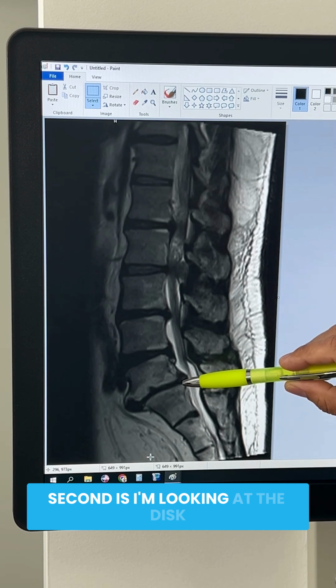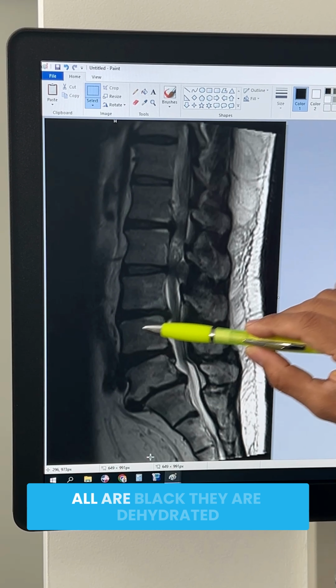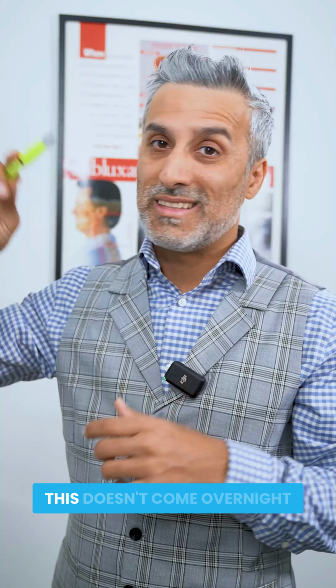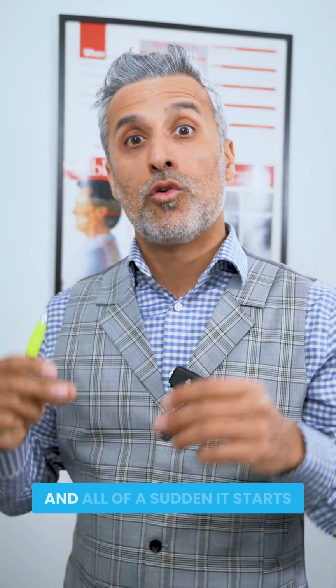Second, I'm looking at the disc spaces. They're very compressed. If you can see that they all are black, they are dehydrated. This took years to develop. This doesn't come overnight. And people often think, oh, I don't have pain, that means everything is okay. And then all of a sudden it starts.